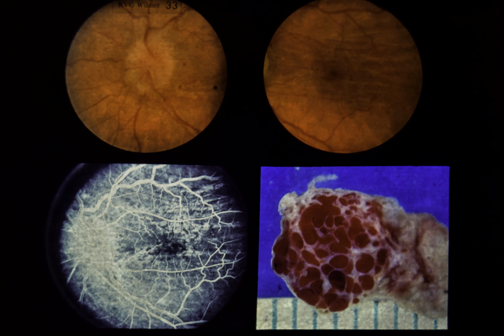Slide 33. Optic disc edema and orbital hemangioma. This 56-year-old female had noted poor vision in the left eye for 1 year. The right eye was normal, but the left eye had 20/30 visual acuity, enlargement of the blind spot, and 3 millimeters of proptosis. Upper left. The left optic disc is edematous and hyperemic. Upper right. Choroidal folds extend horizontally from the disc through the macula.